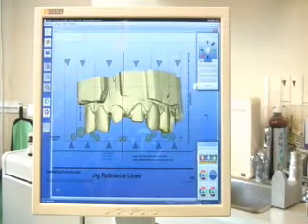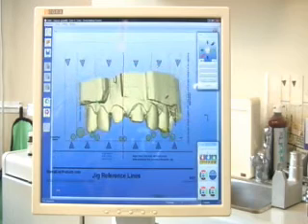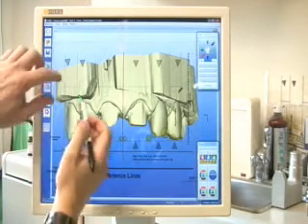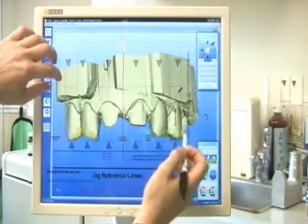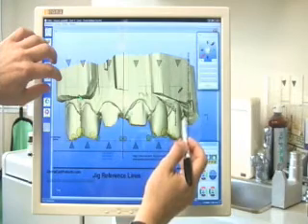By use of the zoom tool in your CAD/CAM system, by enlarging or shrinking the virtual model, we can align the buccal aspects of the cuspids with the outermost vertical lines on the anterior overlay. This is the cornerstone for creating the golden proportions. Once you are happy with the position of the overlay over a virtual model, a few quick marks with an erasable marker will aid in the reproducible placement of the overlay for the subsequent restorations to be done.